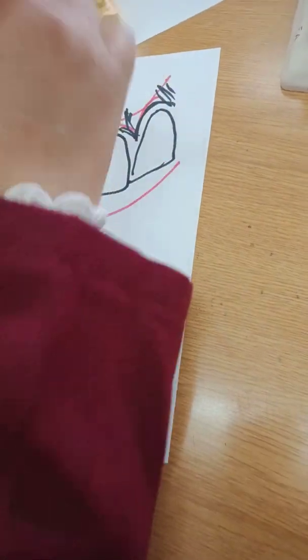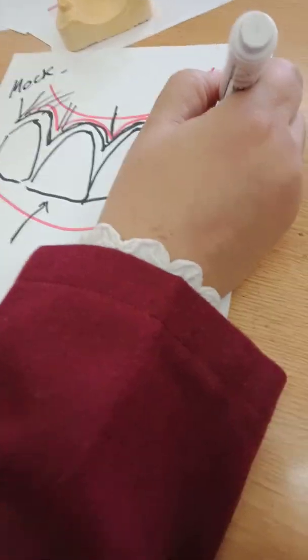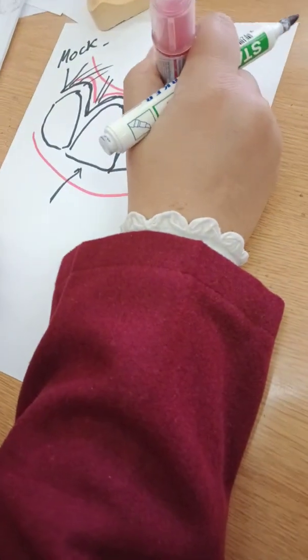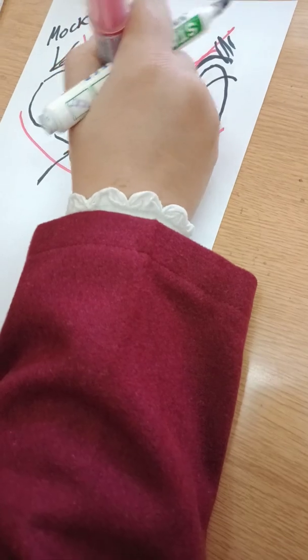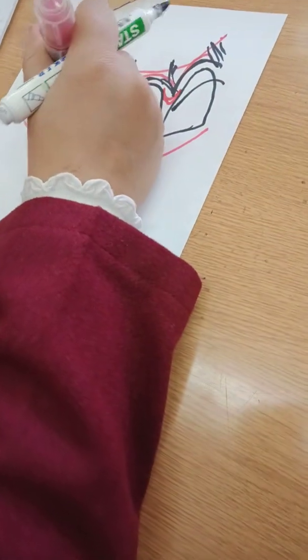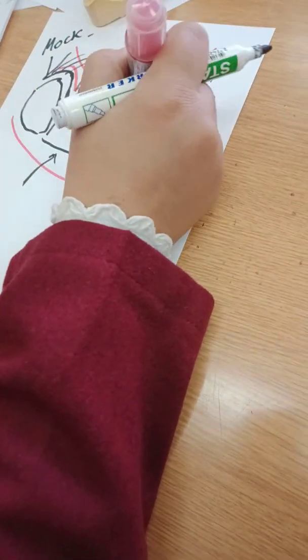Now, the difference in this is where we cut. We cut below the teeth and below the marginal gingiva. Suppose I have marginal gingiva here. Let me draw the marginal gingiva and the papilla. Sorry, the marginal gingiva is here and the papilla is here. So we have papilla and marginal gingiva.